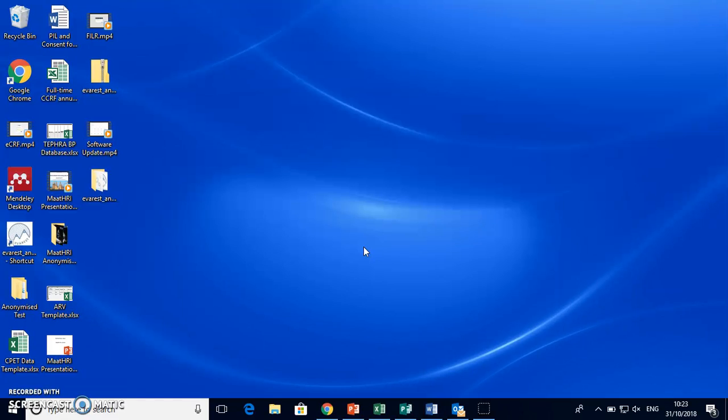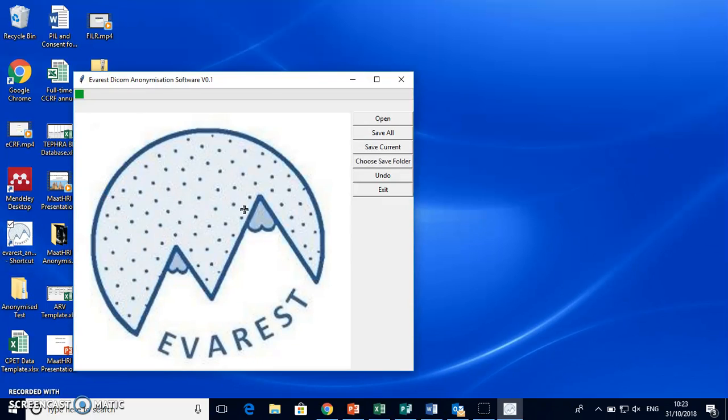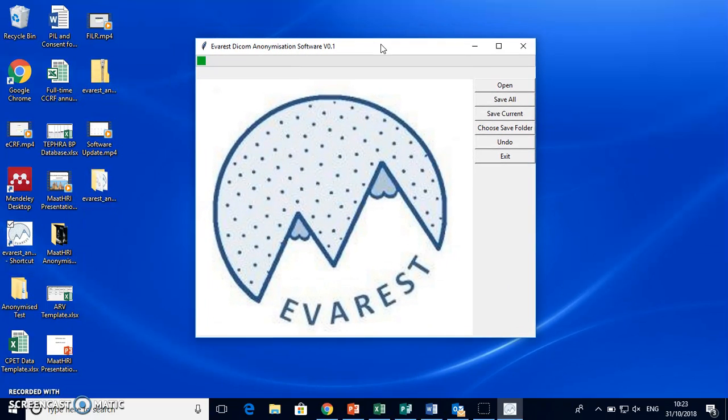Today I'll be showing you how to use the EVAREST Anonymisation software to anonymise your stress echo scans for the EVAREST study. So the first thing to do is to open up the program, and you should have created a shortcut as mentioned in the software download video.